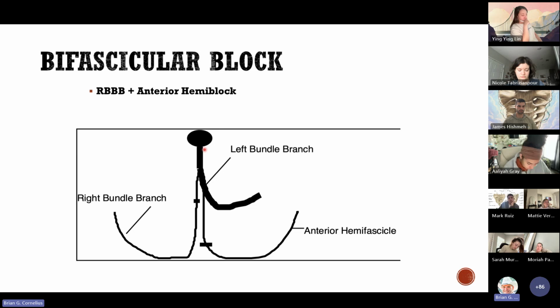So when we looked, we had two components to that left ventricle. We had the posterior component and the anterior component. So what I'm talking about when I say a bifascicular block is a blockade of two portions of the bundle branch. So remember that the left bundle branch by itself has two portions, and then there's the right bundle branch.